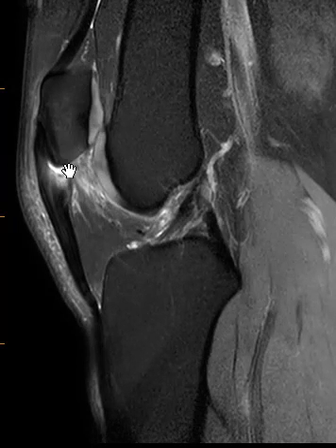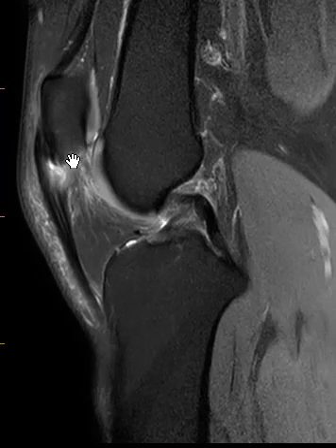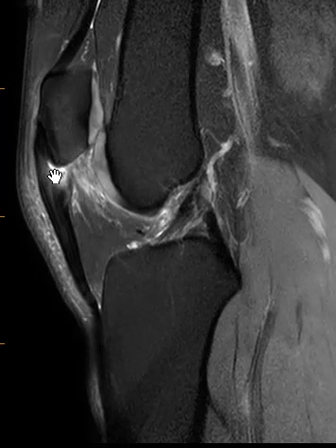This can go on to completely tear if they have a chronically inflamed or injured patellar tendon. It can completely tear, and I saw one the other day where it's almost completely torn, just barely hanging on with the patella elevated. But this is more of a classic one right at the central attachment.